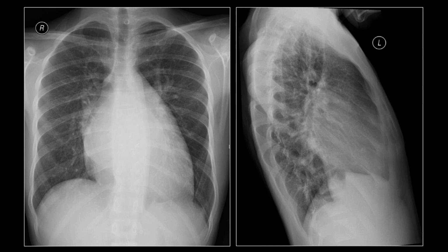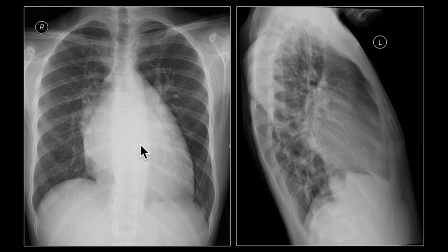So what do we see here in more specific terms? One of the earlier signs of left atrial dilatation is that the border of the left atrium, which should not be seen on a normal case, becomes more clear and visualized, and it projects to the right lateral location, giving you what's known as a double contour sign. So here you see a double contour. This contour here is the left atrium, and this is the right atrium. This left atrium is very big to the extent that you could actually outline the borders behind the cardiac shadow.